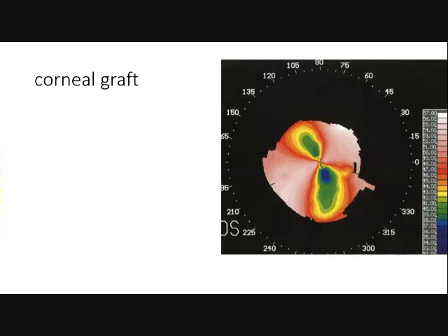We have 10 minutes left. So 120 degrees superiorly and 300 degrees inferiorly, or easily for our convenience, we can use clock hours. 11 o'clock, so 10 to 11 o'clock. Inferiorly where are the warm colors? The red color is here.